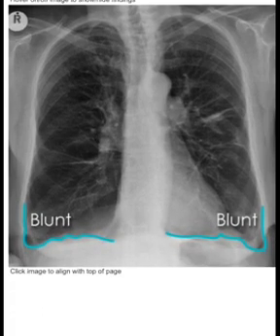Lung hyperexpansion. Both costophrenic angles are blunt due to lung hyperexpansion. The hemidiaphragms are flattened, indicating hyperexpansion. The lung markings are distorted bilaterally. Clinical information: occasional and past smoker, chronic liver disease. Diagnosis: chronic obstructive pulmonary disease, COPD, with underlying alpha-1 antitrypsin deficiency.